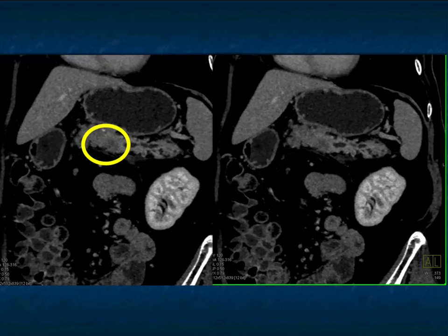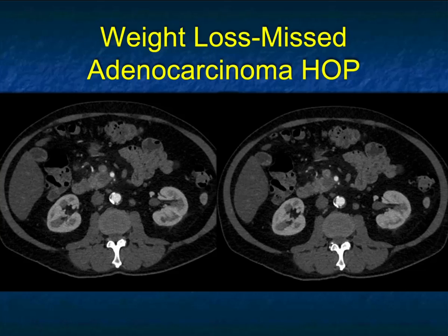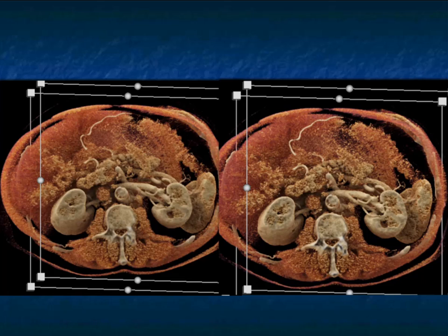And again, when I look at things through the axis along the pancreatic duct, you can see the dilated pancreatic duct, that transition, and that under 2 centimeters hypodense mass. When you pick up masses at this stage, there's no liver mets, there's no vascular encasement. This patient should do very, very well. And here's that same patient with the cinematic rendering. Another patient, this was read as negative, but if you look, there's a subtle lesion. You look at the head of the pancreas, you see the SMA, SMV, this is arterial phase, and then here's the tumor. It's subtle, but it's there. Okay, it's there. And you can see it again on the cinematic rendering.